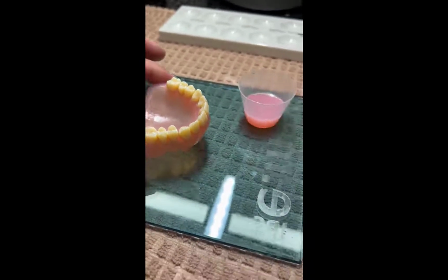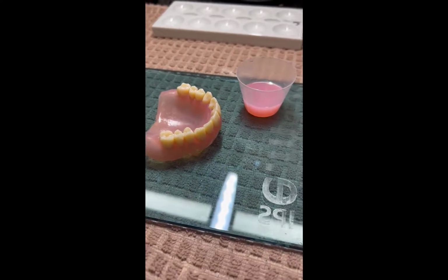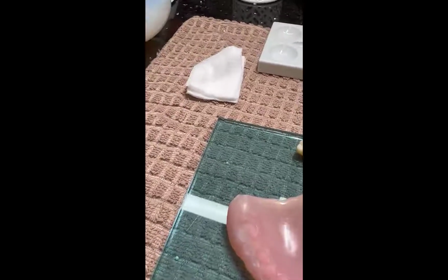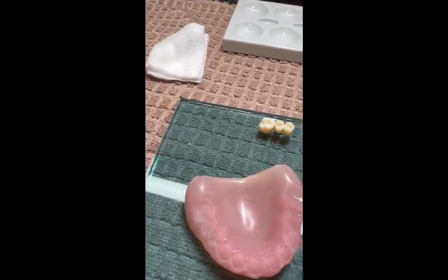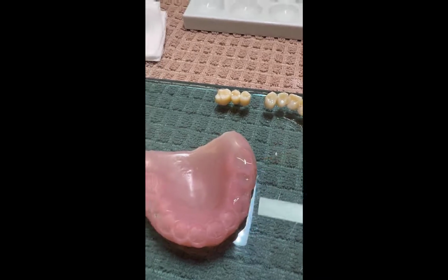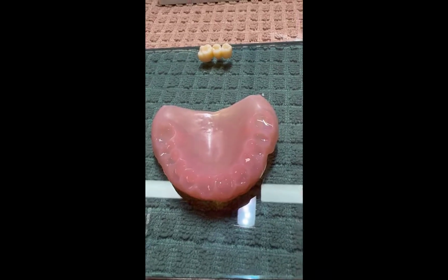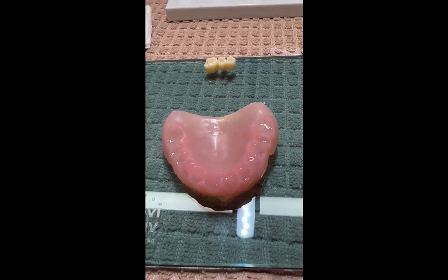So I'll go ahead and do this next step. I'll just drip some resin inside the intaglios, set the teeth, and then I'll cure it in the Curie. And as you can see, I'm just painting the intaglio here with a little of the pink denture resin. And I'll continue on with that for the whole arch. Okay, so here's where we're at. We painted resin inside the intaglio of the denture surface, and now I'll fit the teeth parts inside of that and wipe away the excess resin.